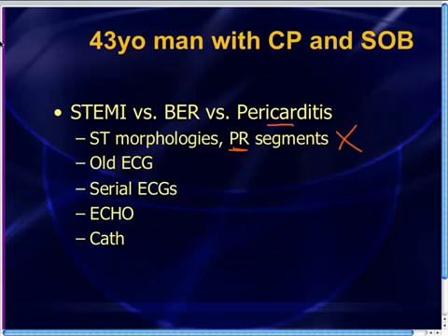Next step, you want to really try to look for old EKGs in this particular type of case. Take an extra 5 or 10 minutes and track down an old EKG. If the old EKG is identical to what you're looking at now, then that means it must be benign early repolarization. If the old EKG is different, then you just ruled out benign early repol, and that means you're looking at STEMI versus pericarditis. And I'll tell you what happened in this case.